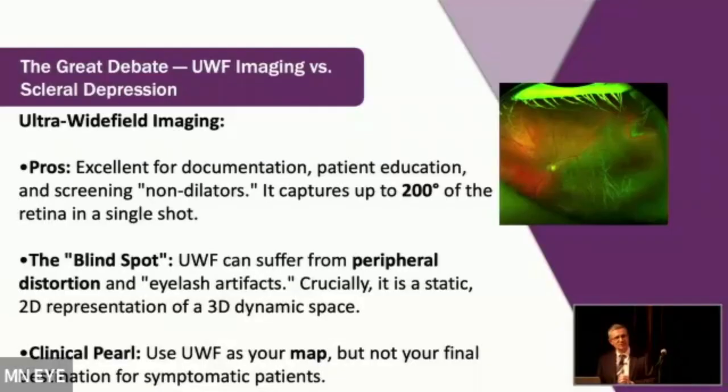So then let's go back to the exciting topic of Optos, ultra-widefield imaging or examination. Do we need to examine them? Do we need to depress patients, or can we rely on Optos?